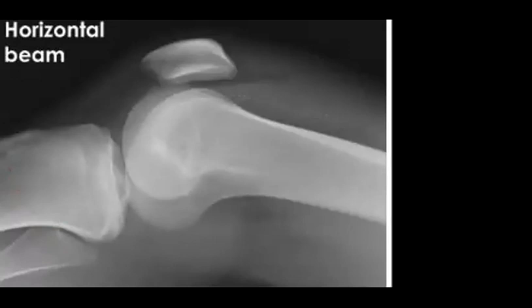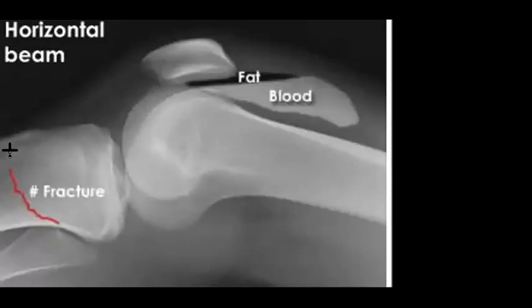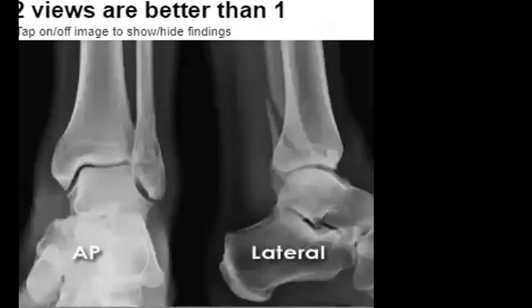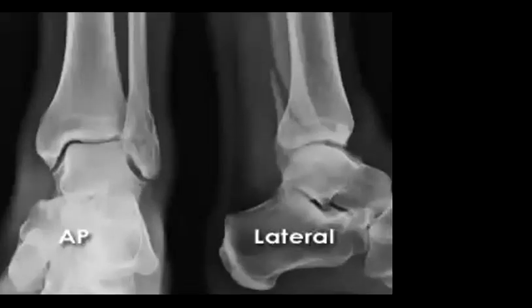And here you will search for tibial plateau fracture, as we saw in the rapid reporting before. It's very important to check the two views, not just one view. Here maybe you can see it, but here it's very obvious.